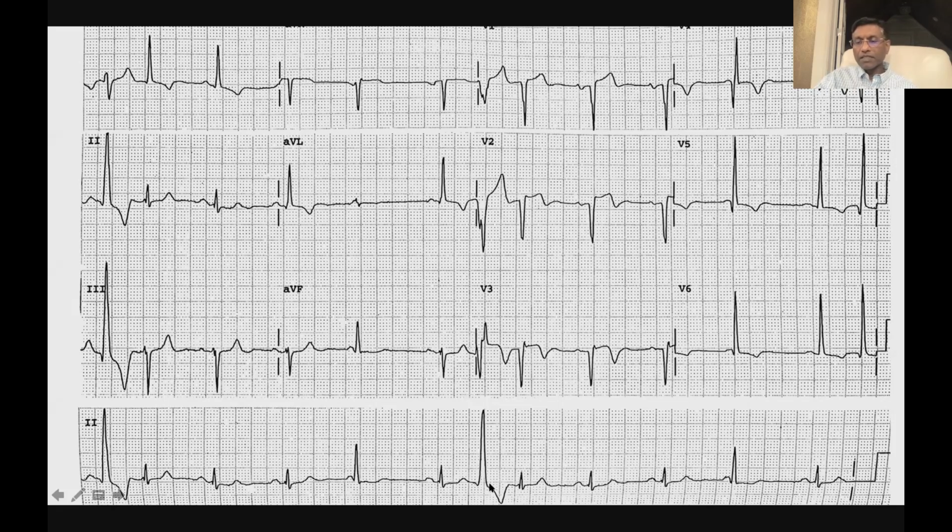So it's a really pretty example of parasystole in the setting of structural heart disease, which is almost always where you find it, in the setting of significant LVH, bad valvular disease, significant coronary disease, because you have little fibrotic islands of tissue around these spots which are firing as PVCs, parasystole.